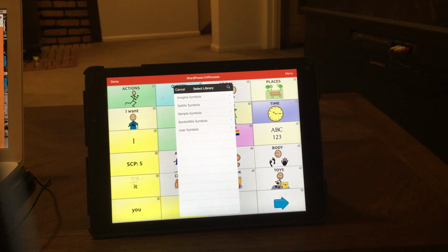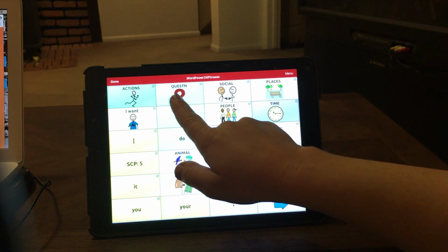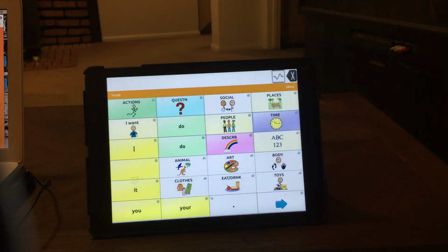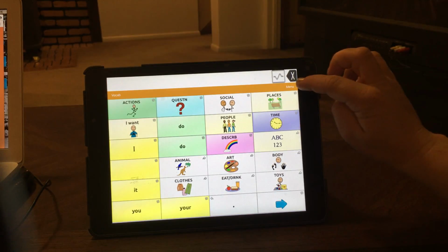TouchChat includes a keyboard option within page sets for the user to create original messages using an ABC keyboard or a QWERTY keyboard, such as in the spelling standard page set. Word and phrase prediction options are available within the keyboards. On the iPad, the smallest grid option are 2 buttons to 400 buttons on a page at one time, with or without the message bar.